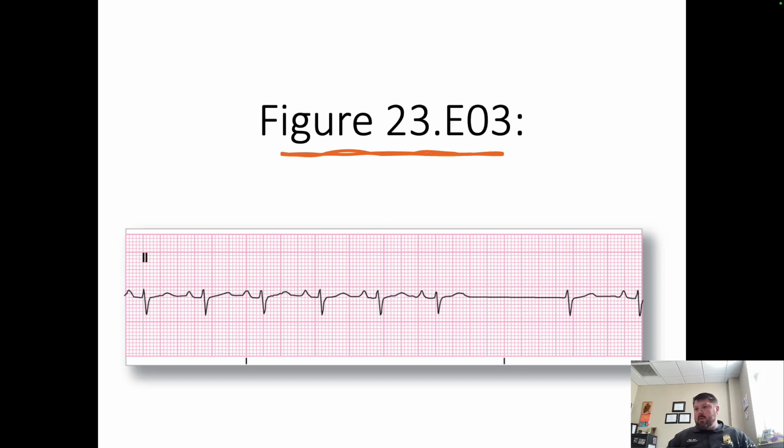So this one, we've got what looks like a pretty strong sinus rhythm underlying, but then we've got a late occurring complex here. No P wave, it's most likely hidden. It's not after the QRS, so we're looking at a sinus rhythm with a junctional escape complex. Again, it's occurring late.